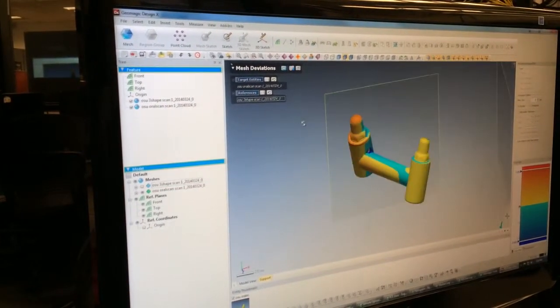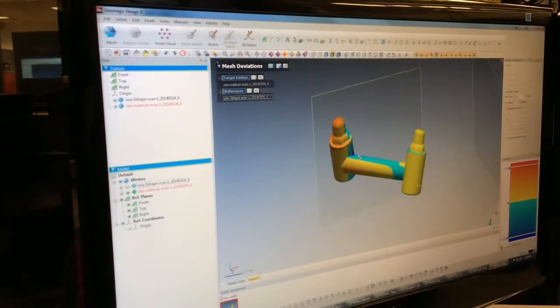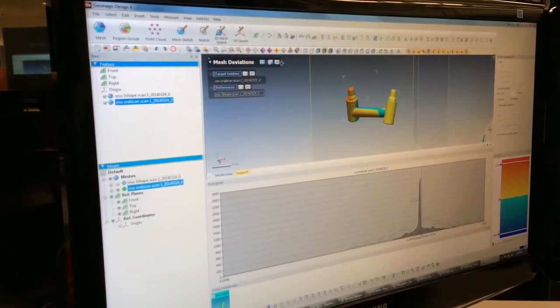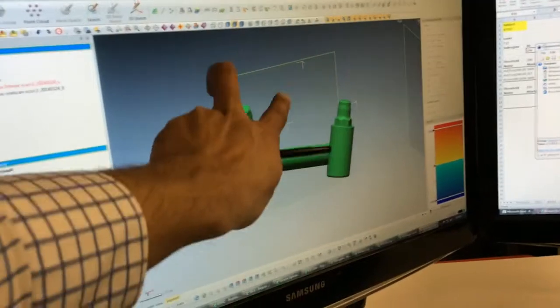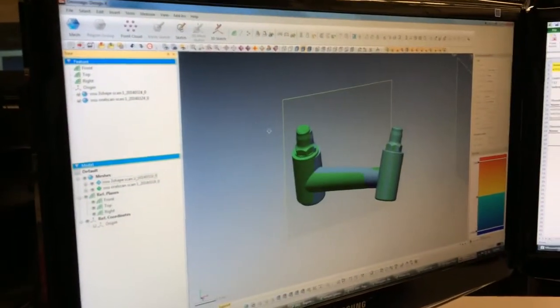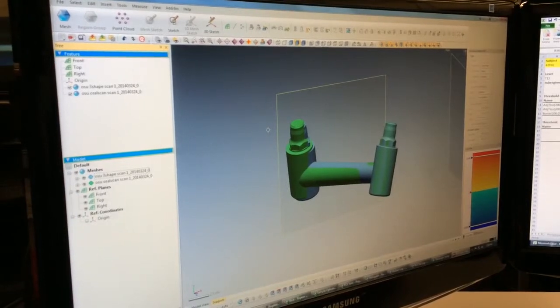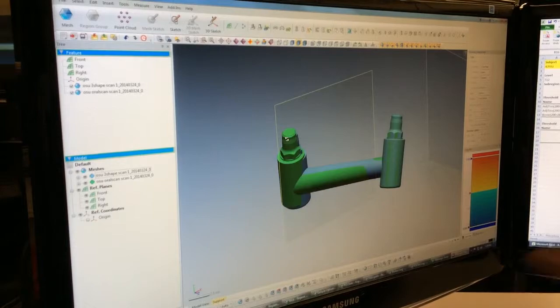So this may end up being useful for you. This is kind of a simplified version of the other one, and again it gives you a histogram. That's good, but I want the histogram only of this part. So how do I do that? I don't know if there's a nice way to do that in here. Well, there is a way to do that.